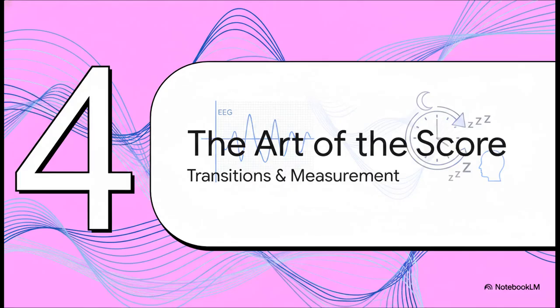And that brings us to our final section, the art of the score. See, knowing the rules for each stage in isolation is one thing, but sleep isn't static. People shift, transition, wake up briefly. It's a fluid process. Understanding that flow is where scoring goes from being just a science to a bit of an art form. This is where a scorer's judgment really has to kick in.